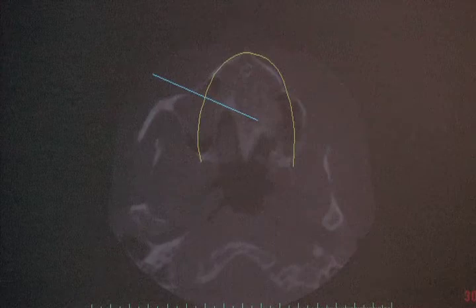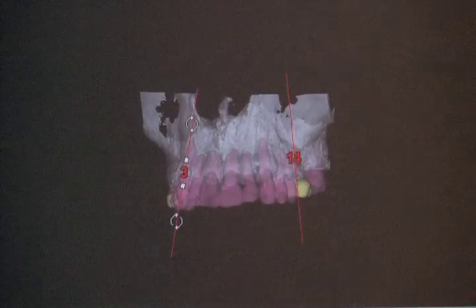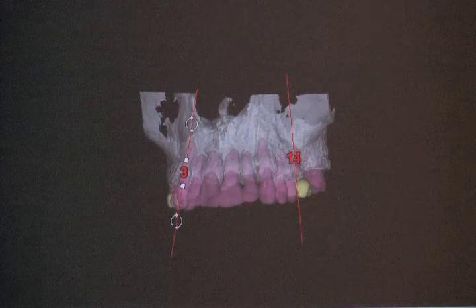And what my intent is to always try to put the longest, fattest implant we can in any individual situation, obviously being very conscious or very aware of the prosthetic limitations. Our crown and root ratio has to be positive enough so that we don't overstress the area.